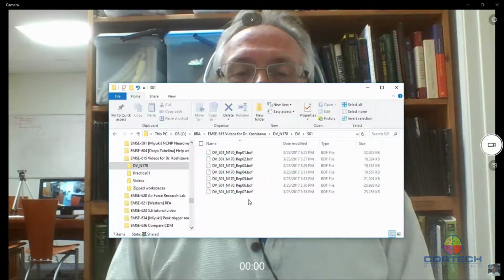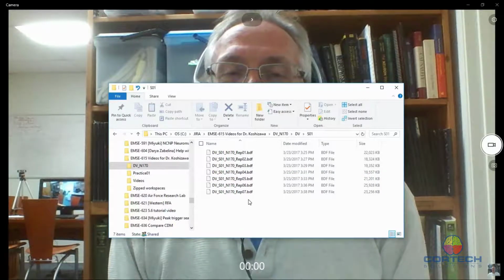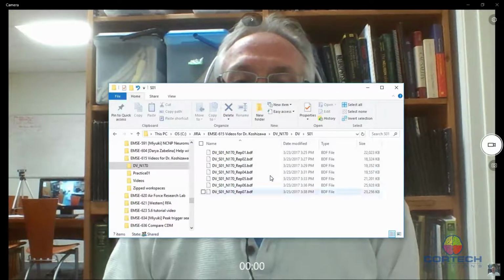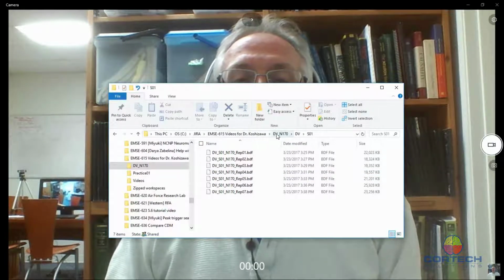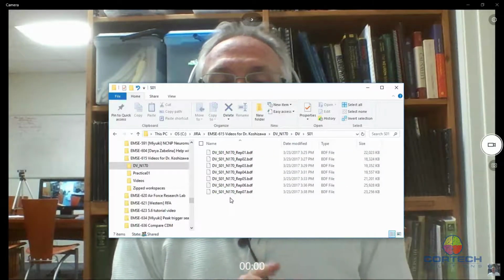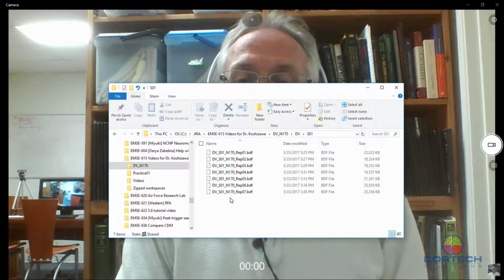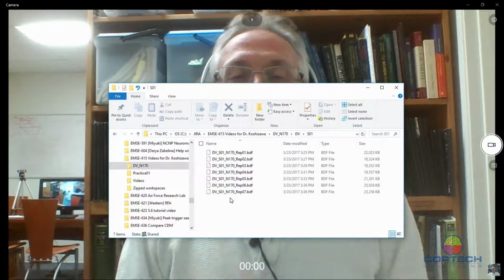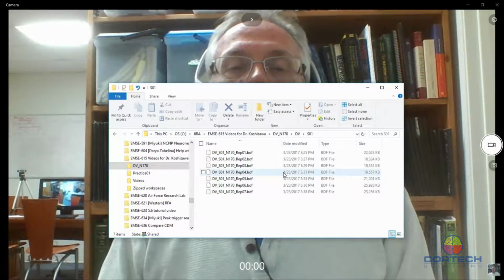We made 7 replications of it, and in the live session recording we made live averages, but now we're offline. We're going to go back to these raw BDF files, and we're going to treat all of these together as if they're one file, and we're going to make averages of face stimuli and car stimuli, and we'll do a permutation test to compare the difference between those. Okay, let's see how that works.